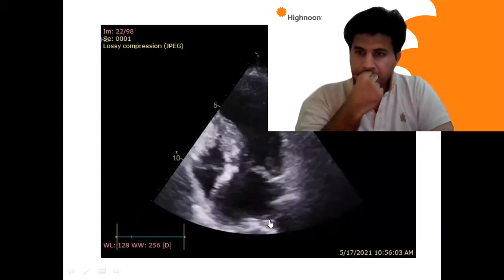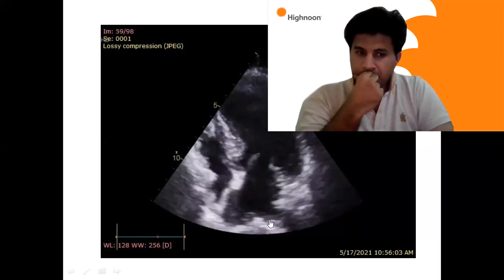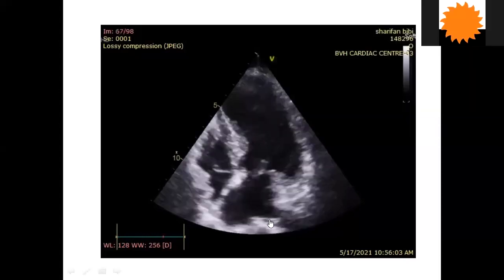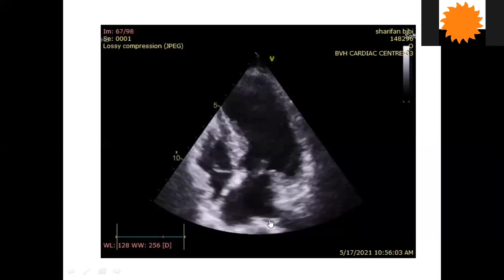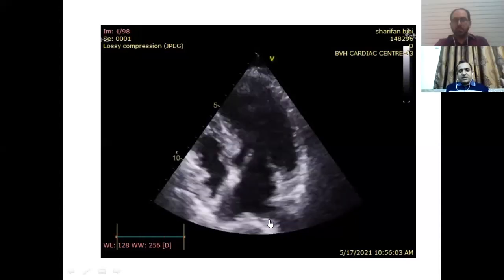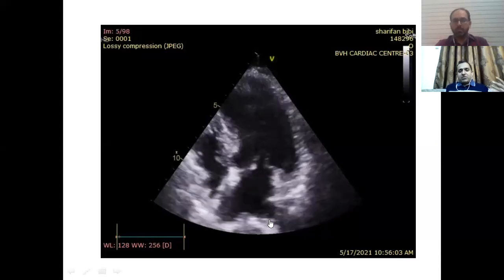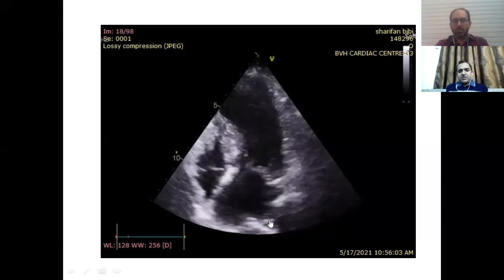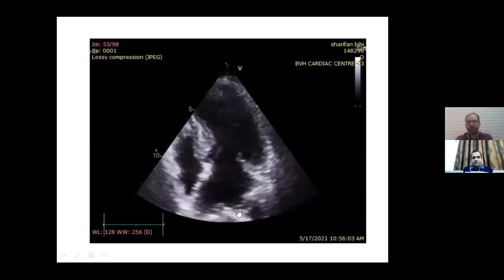This was a real patient, a female patient, now in our follow-up for the last 3-4 months, and she is completely all right. Otherwise, she was on triple inotropes. So when you find a patient with a pansystolic murmur or any loud systolic murmur and in cardiogenic shock, always think of SAM or VSR. Another possibility is VSR, but this is the one real lively case. You can see clearly the SAM.